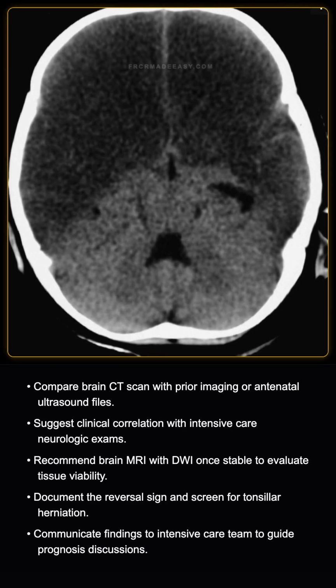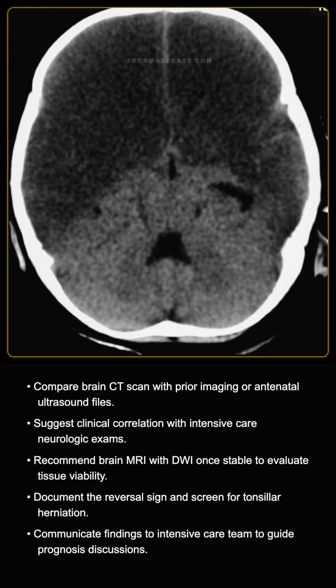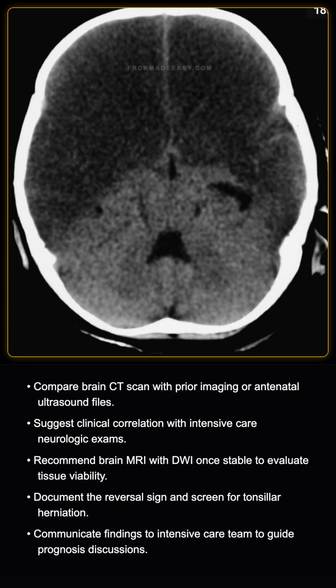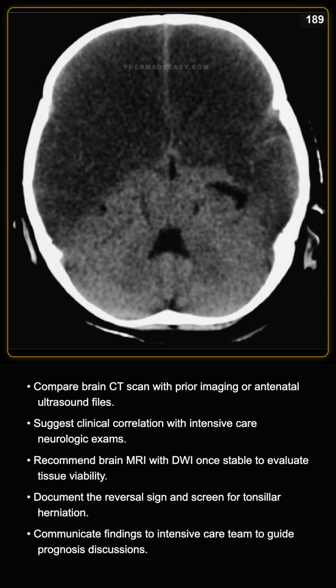I would document the presence of the reversal sign and check for any complicating tonsillar herniation. Finally, I would immediately communicate these critical findings to the clinical intensive care team to guide systemic support and discussions regarding prognosis.